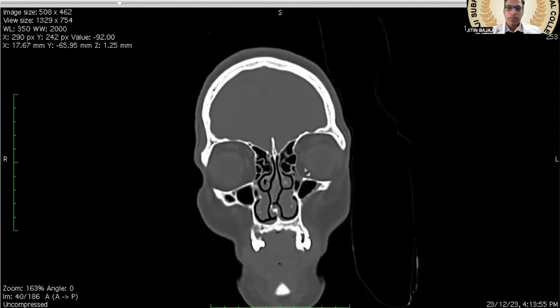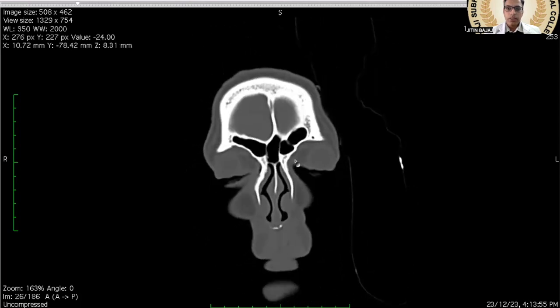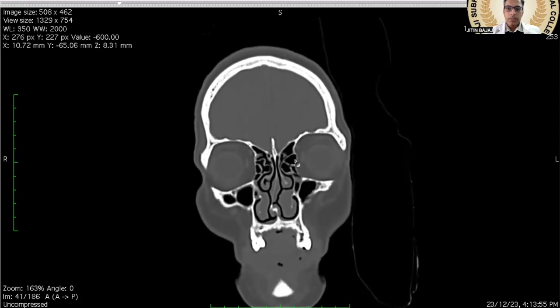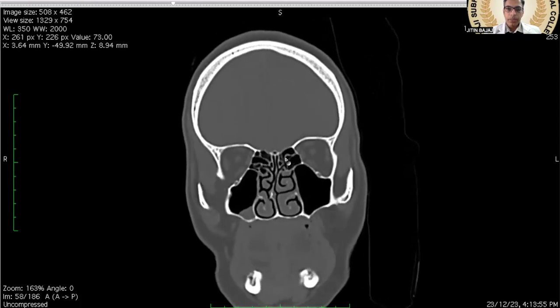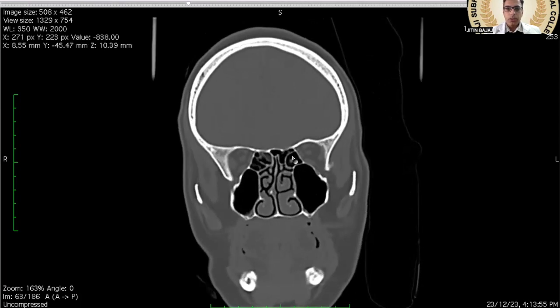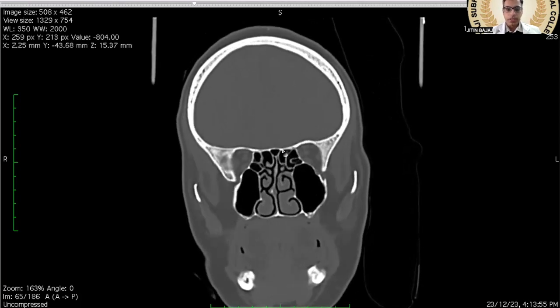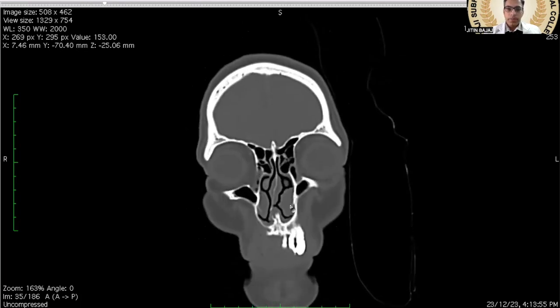So whenever we are working in the anterior ethmoidal air cell group, our working should be directed more towards laterally. And as we go posteriorly, the working should be more towards the medially. Here the fat is less and the bone in the posterior aspect is quite rigid. Another important thing is to look for turbinates.